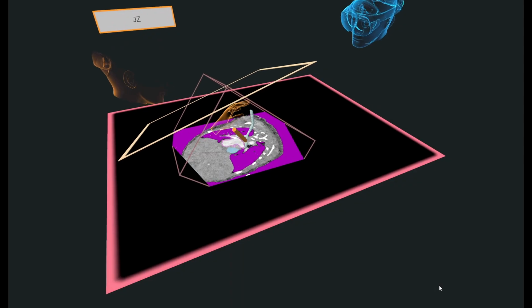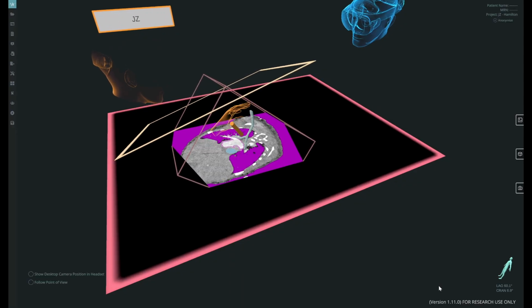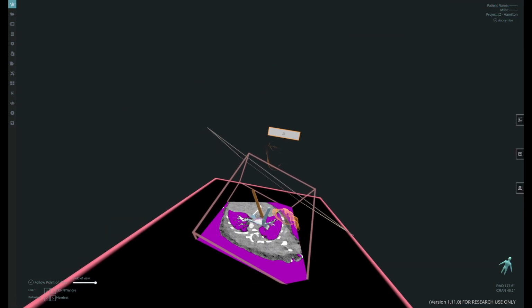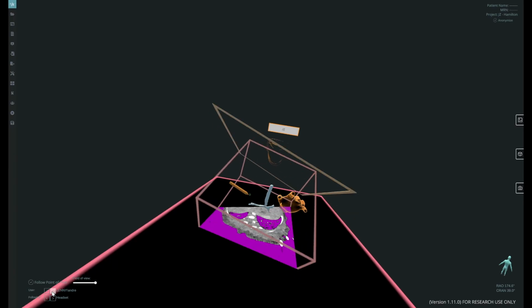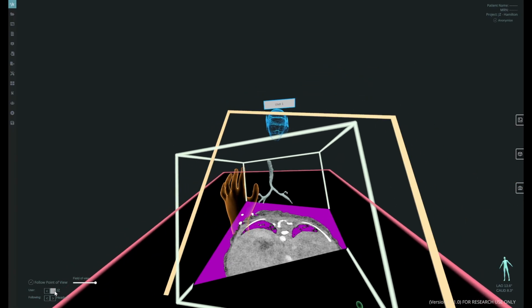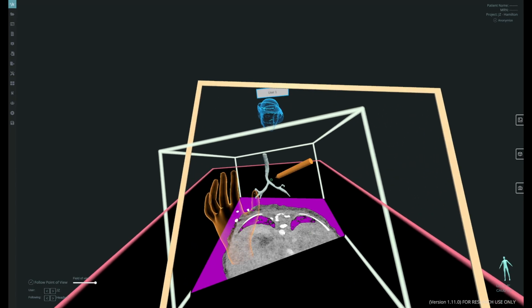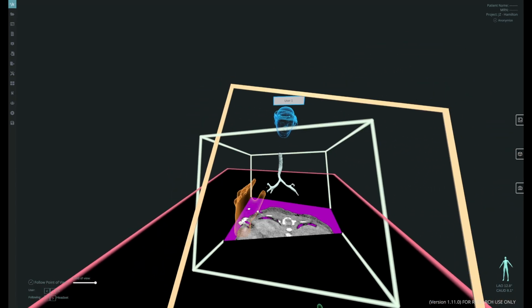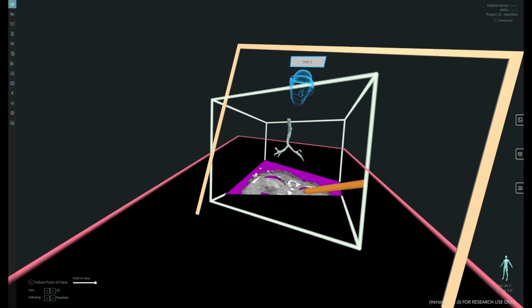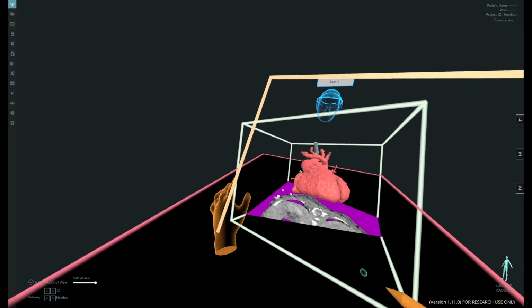We can see how the upper lobe there is compressed. I'll finish segmenting this and show how it looks with the rest of the heart. But based on that anatomy, we know that this patient has a right isomerism based on the anatomy of the airway. So sorry, left isomerism. Then I'm going to bring up the heart here.